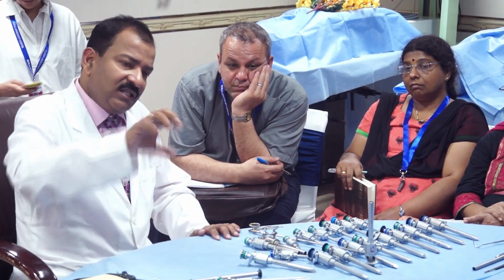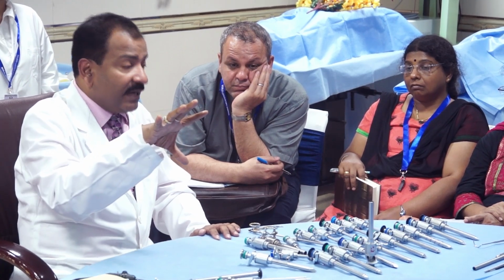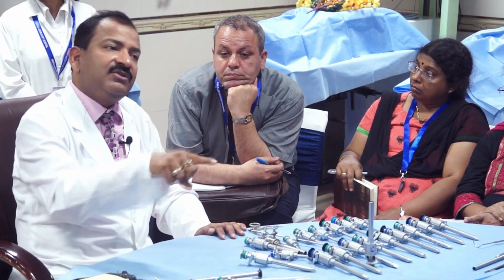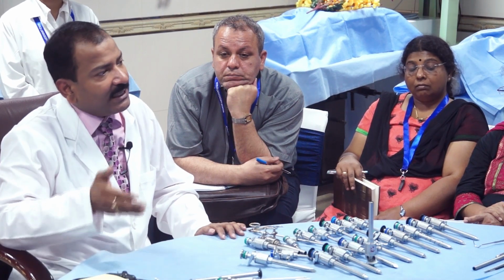A good cameraman, even with a bad camera, can take a good picture, because they can adjust the shutter speed. If light is less, shutter should be slow, and if light is more, shutter should be fast. Shutter means the amount of time for which you are exposing the camera to light. Aperture is also adjusted. Fibroscope filter: if you are doing hysteroscopy, you will not use the same setting as in laparoscopy. The setting will change, and then you have to use it accordingly. Every surgery has a different setting.